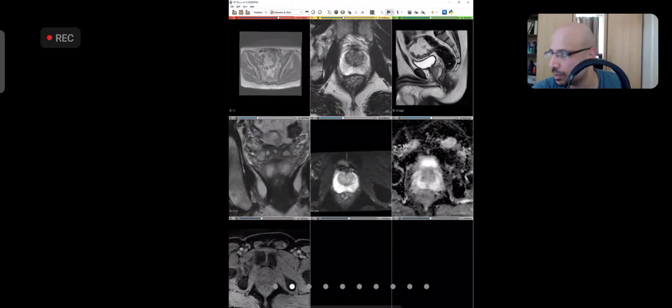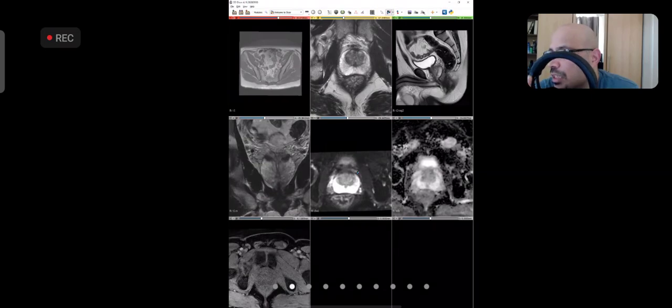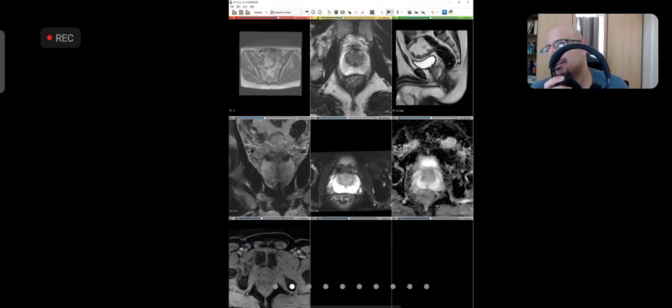Then this is the diffusion-weighted imaging series. We acquire typically at B50, and then there are several B strengths, I forget, but we go from B50 up to B1400. If you have a very modern, very powerful scanner, they may go up to B2000, but in my practice, I find B1400, the highest strength gradient, is well sufficient for most clinical applications.